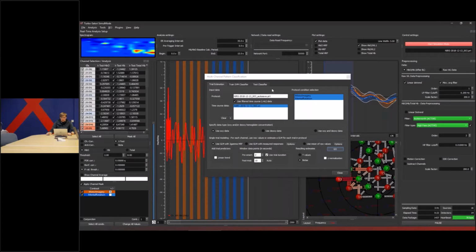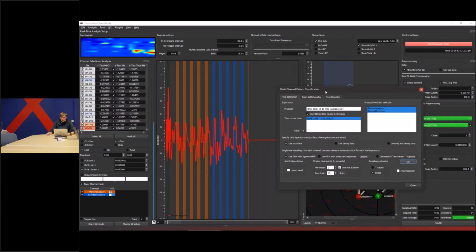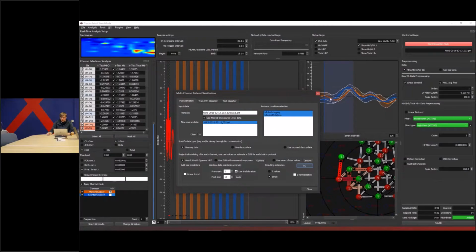You can just go to this tab, and as soon as you've finished this analysis, it will automatically fill in this information. Now, I don't want to go into too much detail here. I just want to show you how it would basically work. The most important thing is that you extract from your data all the periods that were used to create the task.